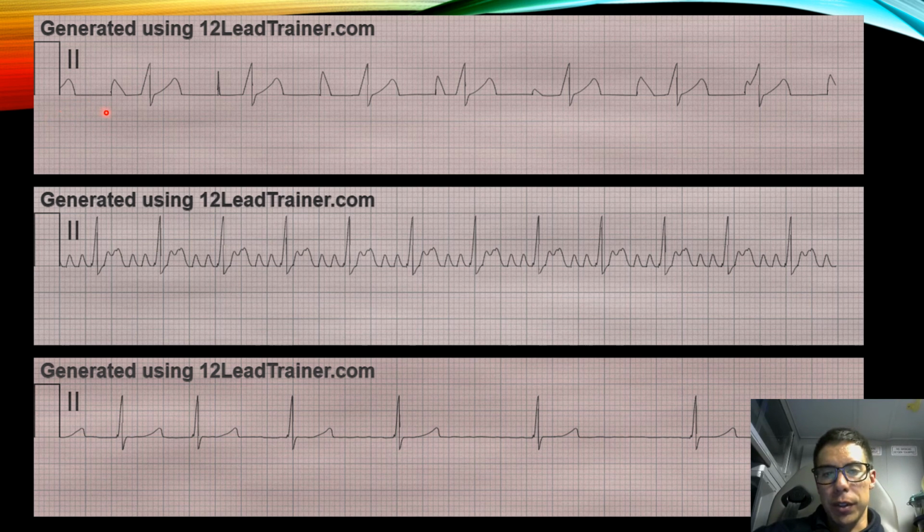All right, so first one, is it regular? Yes, I think, yeah. It looks pretty regular. Yeah, sure. What's our rate? Rate's about 100-ish.